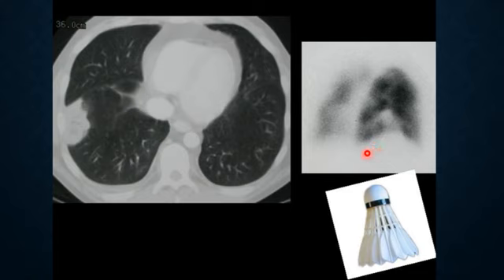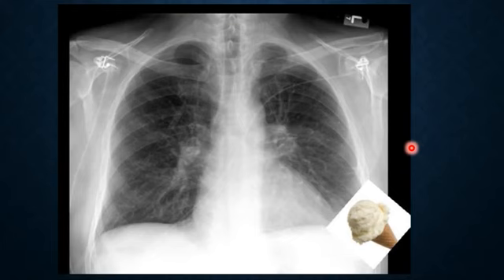This is ventilation perfusion or VQ scan, showing this area of lost radiotracer activity due to pulmonary infarction. And again, you can see the big hilar sign here and here. It's bilateral pulmonary embolism, resulting in some very faint wedge-shaped area, might be seen here or there, and you need a CT scan to confirm that.